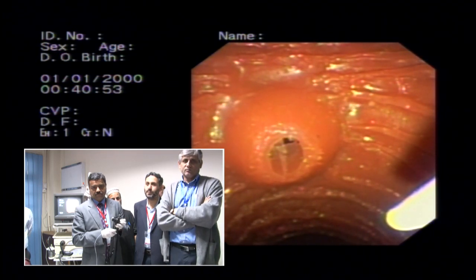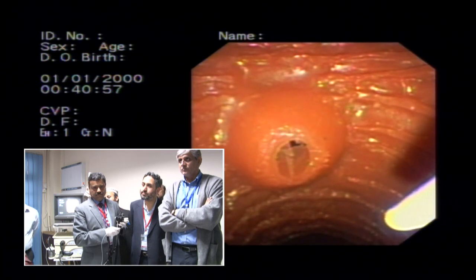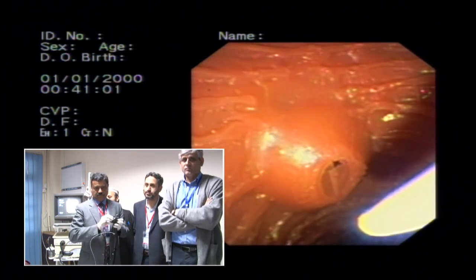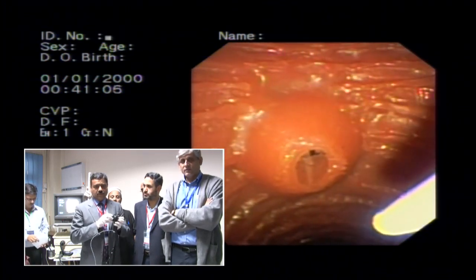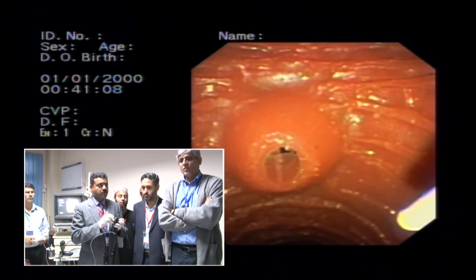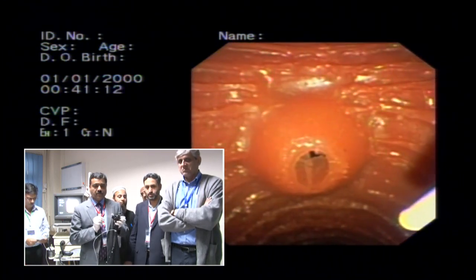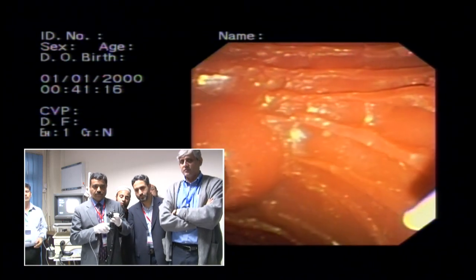I think in the course we run in Liverpool, we spend 2 days on this model, doing all the instructions, and make sure you are fluent in it. So you mostly do this. You don't use this. No, not for moving the ampulla. Does it? No, I use this for cannulation. The small wheel a little bit.